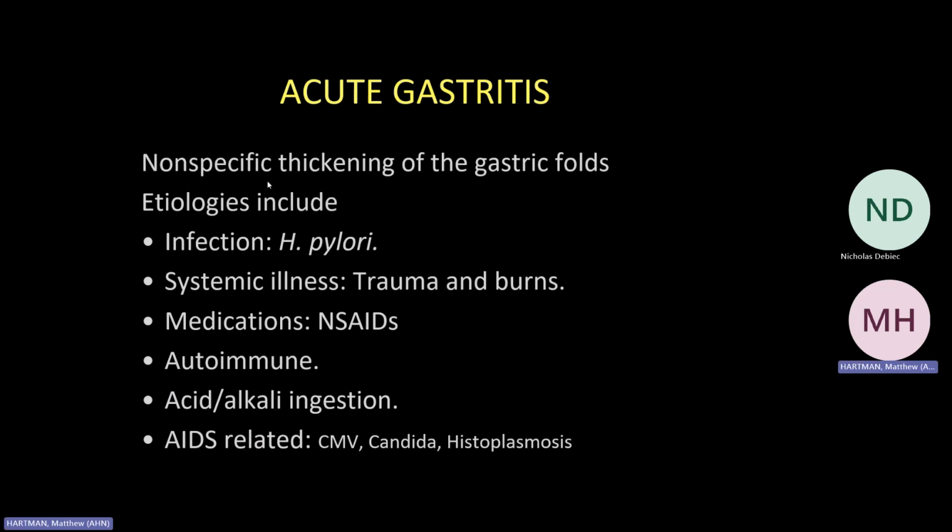And the fold thickening is non-specific, but with that history of NSAID use, that points us in the right direction. Other gastritis can be caused by H. pylori, trauma patients, burn patients, autoimmune situations, ingestions, and certain complications related to HIV.